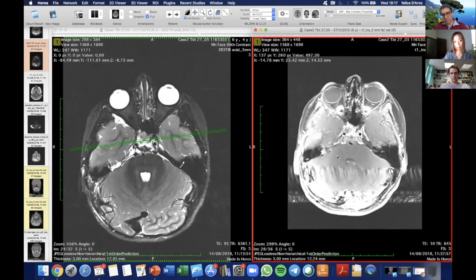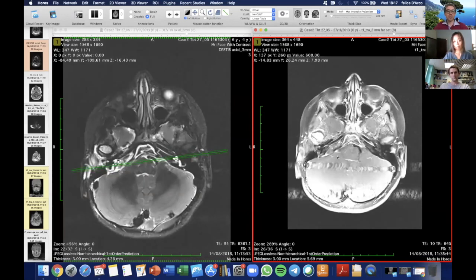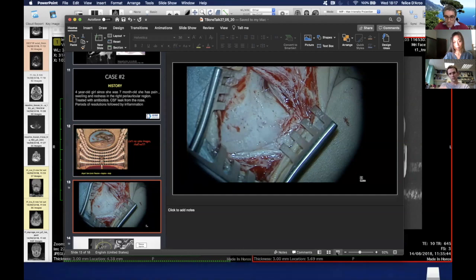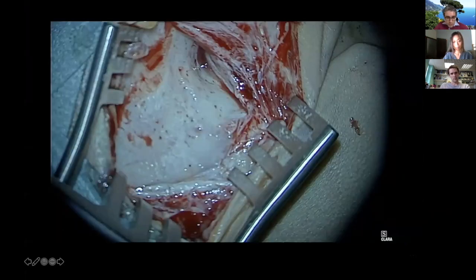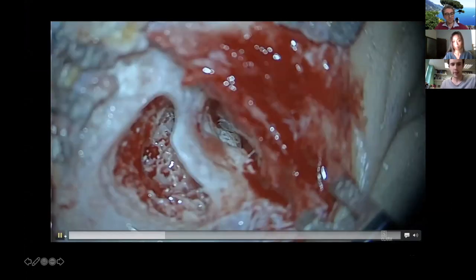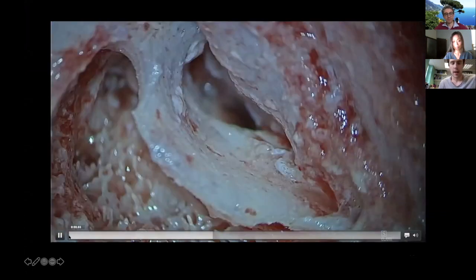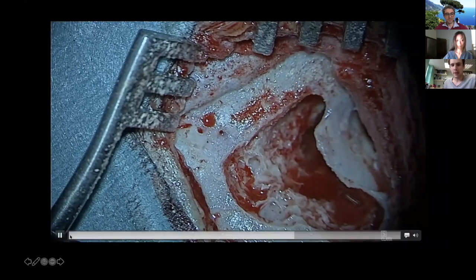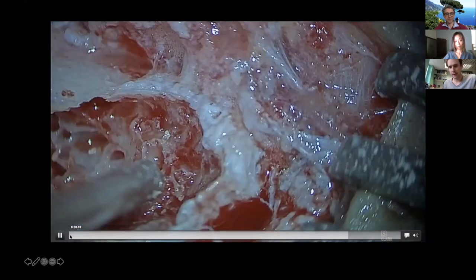I didn't notice this difference before speaking with Rob, looking at the post-operative images, and he will speak about the intraoperative video that he did, and that's it. So with widespread skull-based changes like this, obviously we think of a number of things it could be, but I think obviously this was a very difficult case to manage.